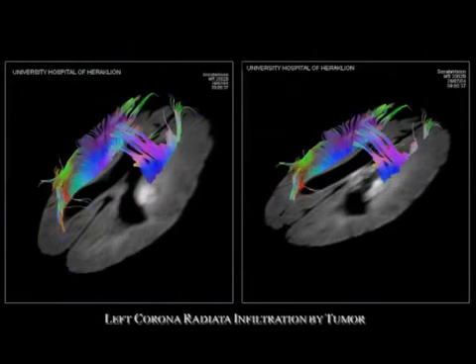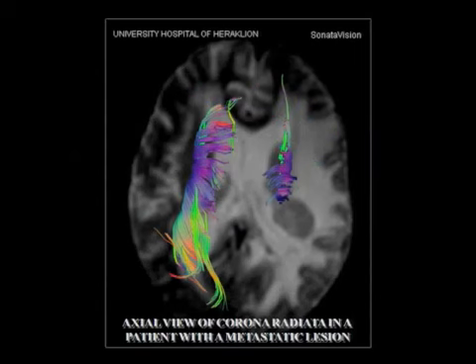From our department, another infiltrating tumor with destruction, infiltration of the corona radiata here, as you see, and another tumor, a metastatic disease with the destruction of the fibers. Fiber tractography is a very fascinating and promising method, but keep in mind that it has many limitations. It's difficult to resolve crossing fibers. It's a user-defined process, and keeping this in mind, we can use this knowing the limitations and the potentials. But of course, it's very useful for a neurosurgeon to have functional MRI on one hand, and on the other hand to have fiber tractography and the tumor.